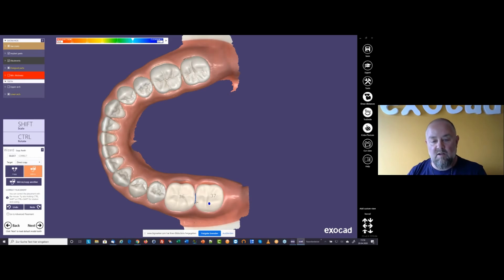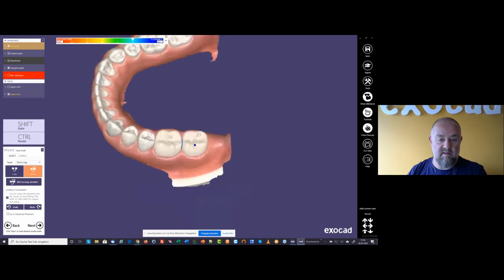The software automatically detects where you place it. So if, for example, you place it on the minimum thickness of a tooth 25, it will be automatically applied as this tooth. So therefore, you really have to pay attention to where you place it.